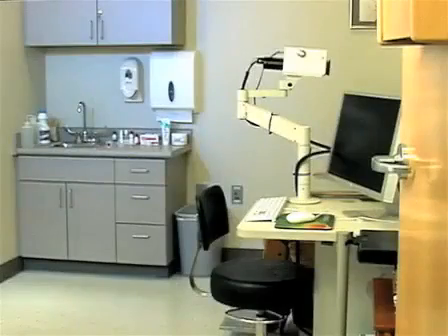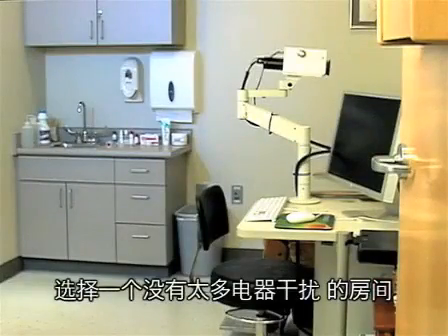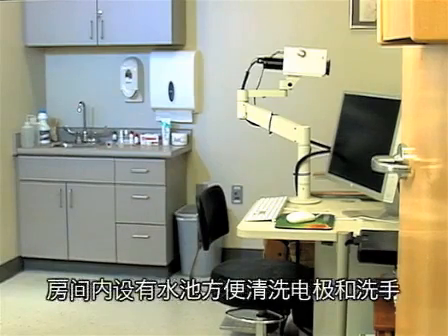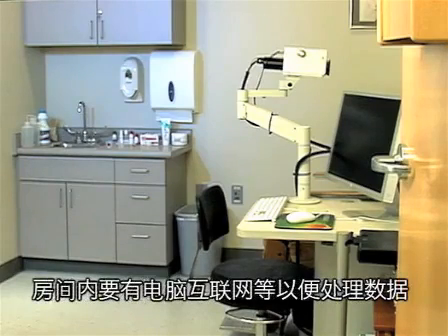When selecting a room for electrophysiological recording, choose a room with little electrical interference. Do not choose a room adjacent to a source of high voltage interference such as an elevator, high amperage autoclave, or centrifuges. A room with a sink is convenient for washing your hands and cleaning electrodes.